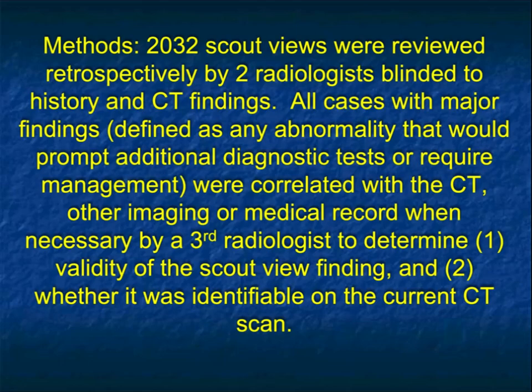And when they did the deposition in court, they asked the radiologist, well, the jury can see the fracture. Why didn't you see the fracture? He goes, radiologists don't look at topograms. Okay, obviously he lost that case. Now, this is in an article by Dr. Berlin. It's worth reading. So to look at the importance of topograms, we had 2 expert plain film radiologists, Bill Scott and Bob Gaylor, who are both retired.